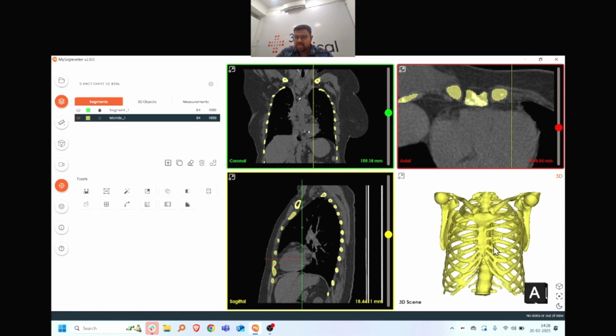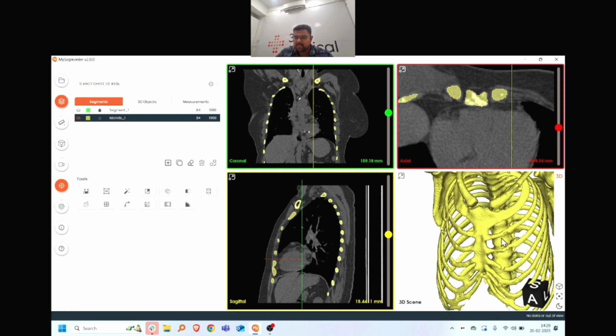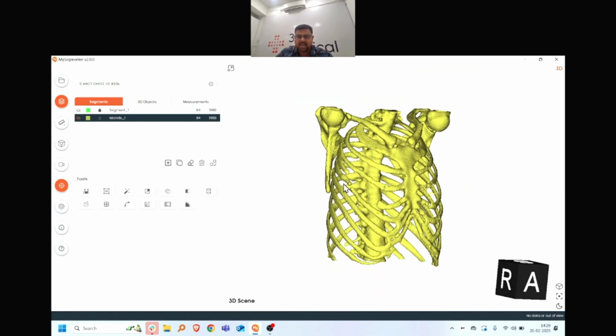So yeah, I have this nice bone information over here, and it has soft tissue captured as well for our reference. So that's an additional good thing. And I want only the ribcage side of the structure over here. So let us maximize and let us edit this a bit so that we can clear other areas. So I'll use this edit segment over here, and I'll use threshold. Now I'll keep off threshold, and I'll use the lasso brush because it gives me more freedom to edit the areas.